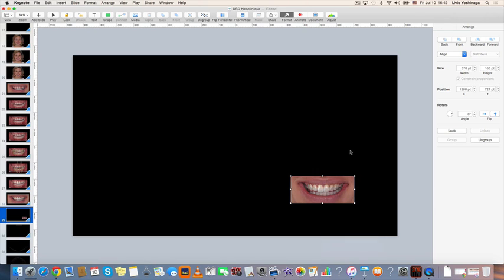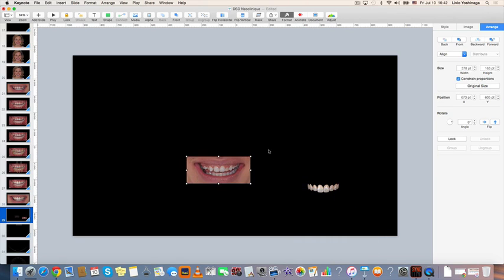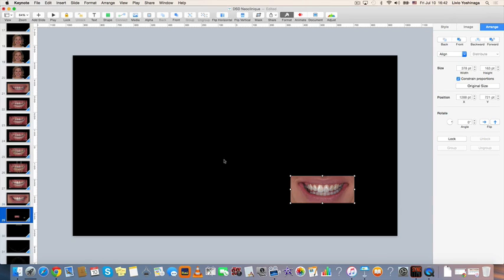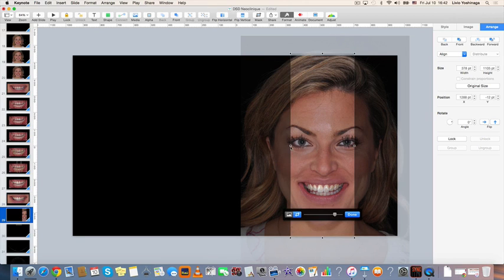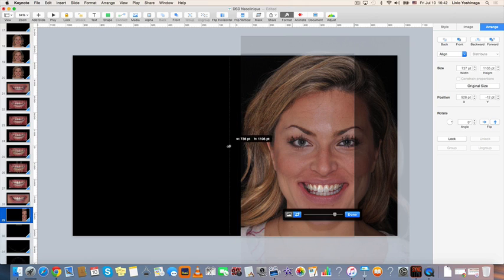Remember, I'm going to ungroup and take this photo. Remember that this picture is just behind that, on that position, but this picture is actually her face. So Command Z to go back here. This picture I can now mask, and actually instead of masking, I am sort of unmasking. And unmask means I can then select, I don't need to go all the way here.